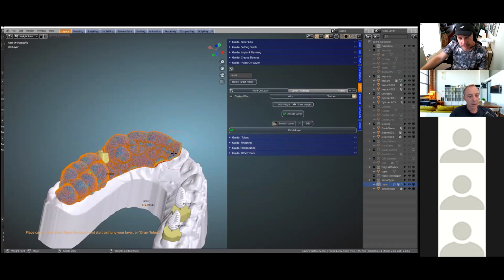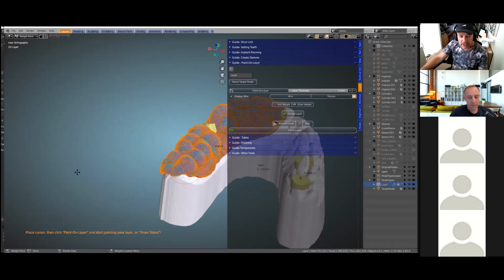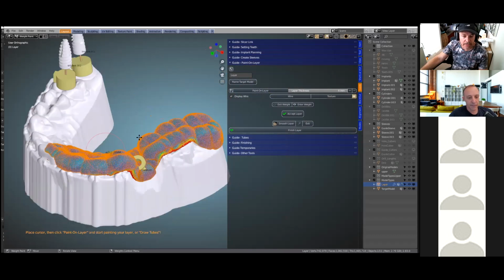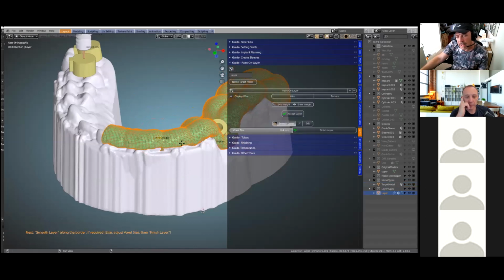So here, can you go right over the, will the interference be taken away, Michael, from the sleeve? Because you've sort of intersected over the guide sleeve. Yeah, so this is where the cutting tools will get rid of all of that on the inside. So ignore the sleeve at this stage. We're just painting the layer. That's all we need to do. All right, something like that. Accept this layer, and then we'll give it a quick smooth layer.